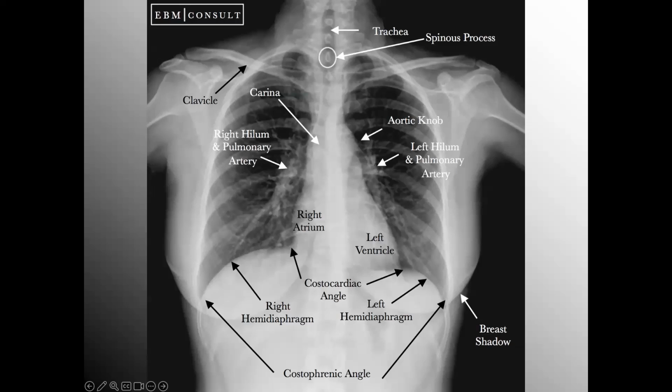And there are nuances to everything, and certainly there are exceptions to the rule. But what you're seeing here on the screen are landmarks that most of the time, less maybe the breast shadow because we have different patients, of course, but most everything you see here, you should, under normal circumstances, be able to identify with ease if you know your anatomical landmarks. And I want to remind all of us that there are certain landmarks that are relatively immobile outside of a traumatic event.